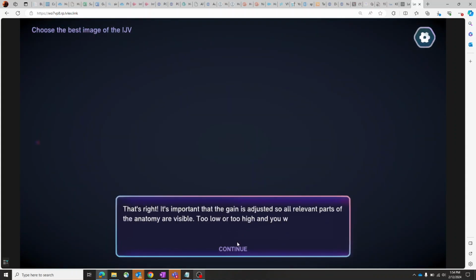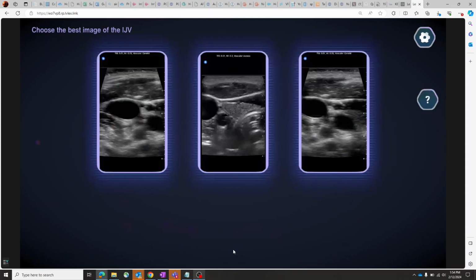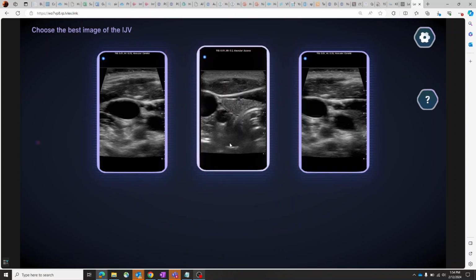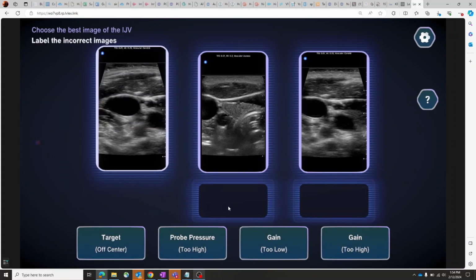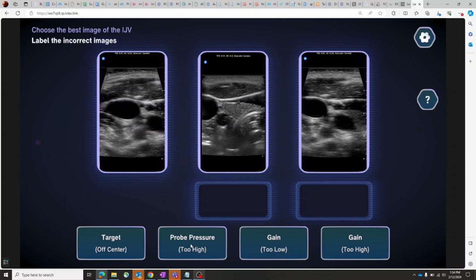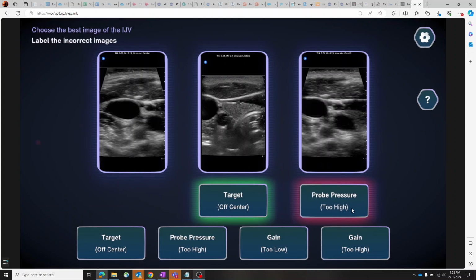And then within that volume, we're able to go voxel by voxel. And to each voxel, we can assign values of acoustic impedance, attenuation, and coefficient of backscattering. What that does is that then informs the physics generator to tell you kind of how the 3D anatomy would look if it were to be interrogated by ultrasound waves.